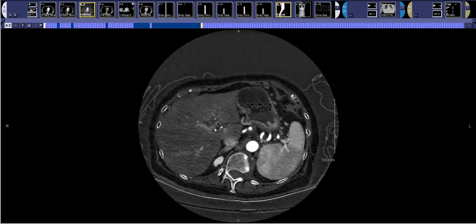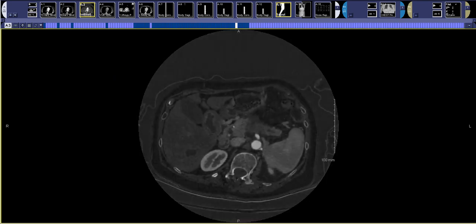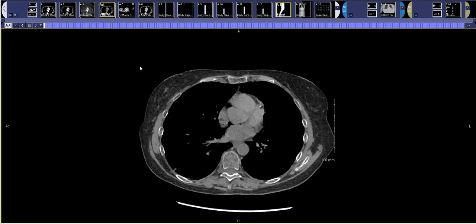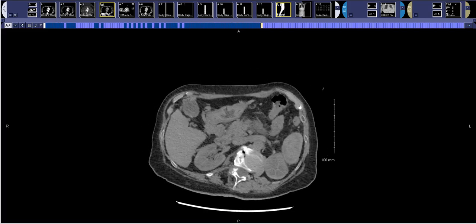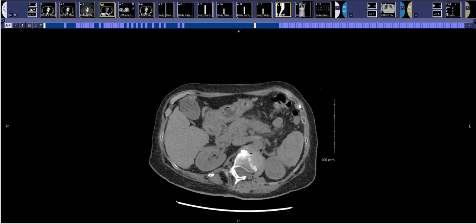The iodine map is nice in that it can give you a high contrast image between your pancreatic parenchyma and the tumor, especially if you window aggressively like I just did. However, if the pancreas mass is easy to see, I really don't pay attention to this at all. The virtual unenhanced portion of the dual energy pancreas protocol CT is not really used for much. It doesn't cost the patient anything to get in terms of money or radiation, so we routinely do it, but rarely is it needed.